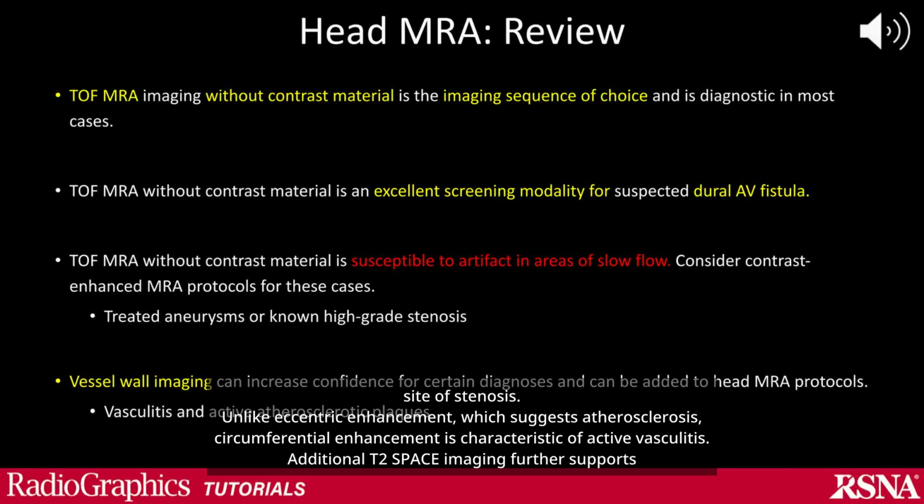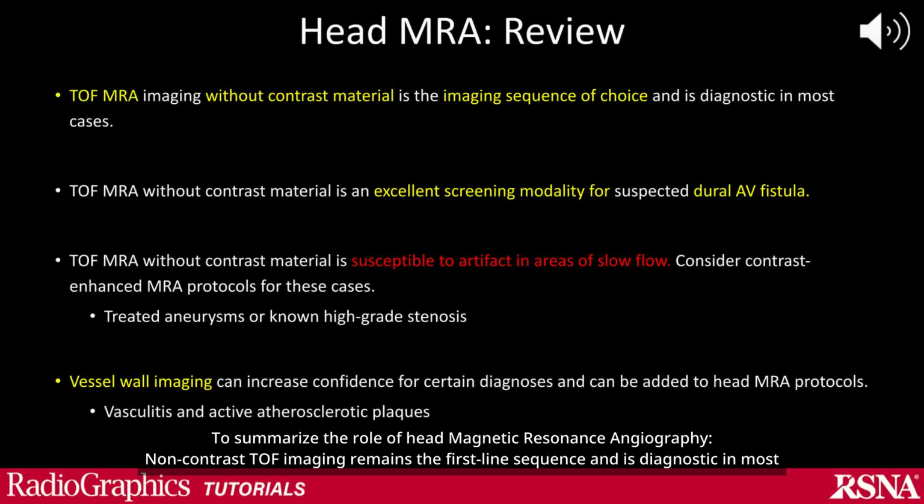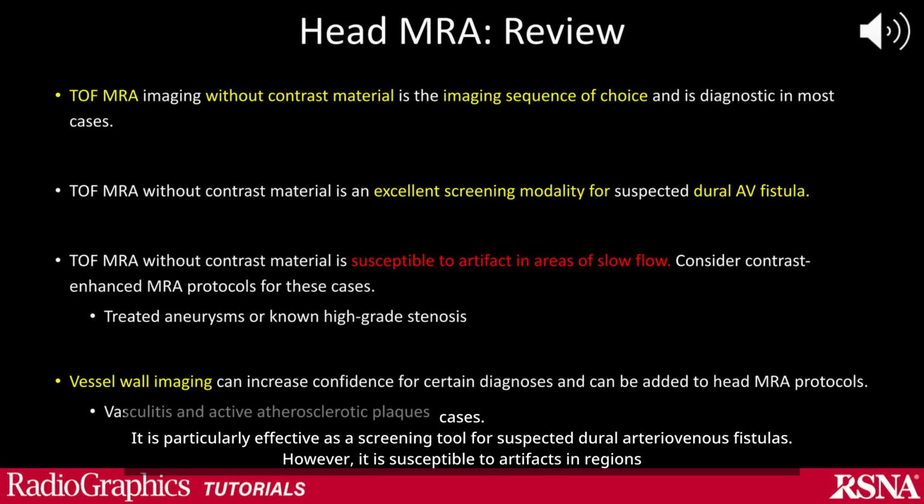To summarize the role of head magnetic resonance angiography, non-contrast TOF imaging remains the first-line sequence and is diagnostic in most cases. It is particularly effective as a screening tool for suspected dural arteriovenous fistulas.